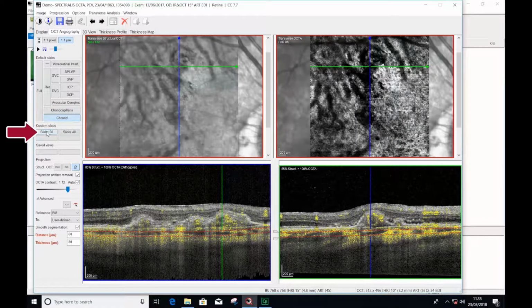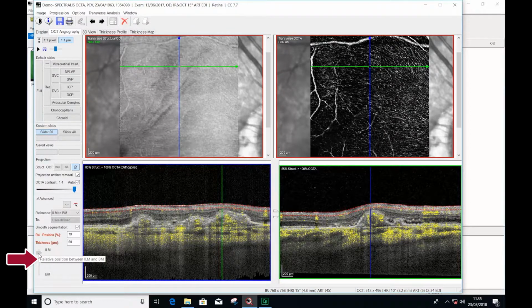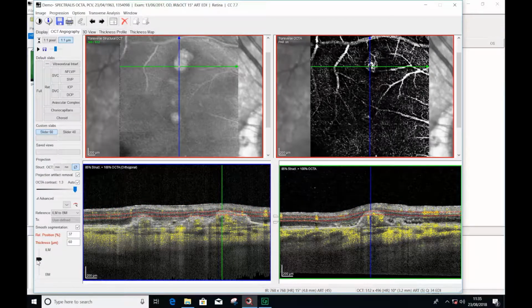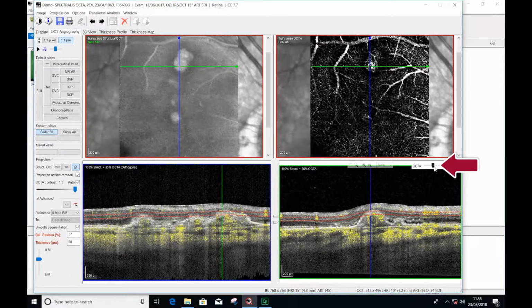Using the slider tool now, and moving the segmentation slab down from a superficial position to a deep location, on the transverse section OCT we start to see a series of circular or oval lesions appearing, and this correlates to the first vascular lesion. We see a tented appearance to the RPE with a hyperreflective circular lesion beneath, in which we can isolate flow.